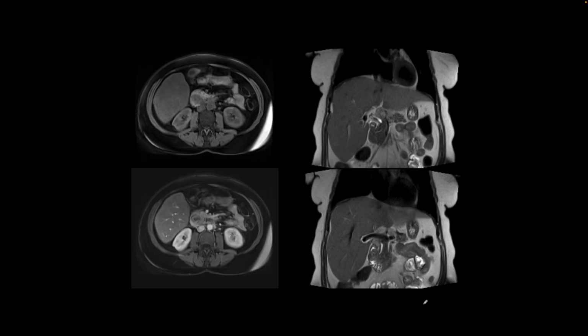This is our next patient. Here we have a congenital abnormality of the pancreas. So we'll start with the T1 fat saturated axial image right here. Normally there is high signal intensity of the pancreas, and we find that this normal high signal intensity goes all the way around the duodenum. And so this is the pancreatic duct that is more anteriorly opening, superior to the opening of the CBD, and this is more posteriorly that we see the CBD.